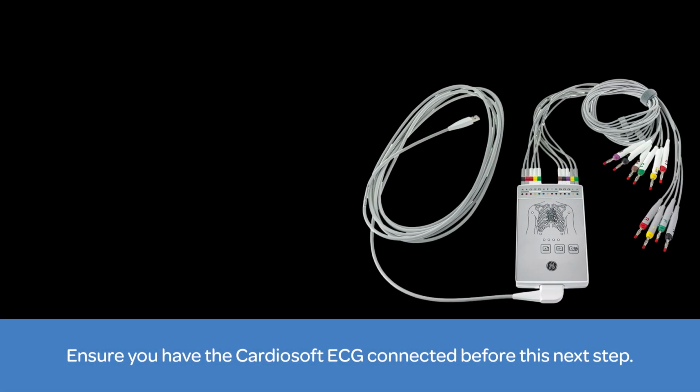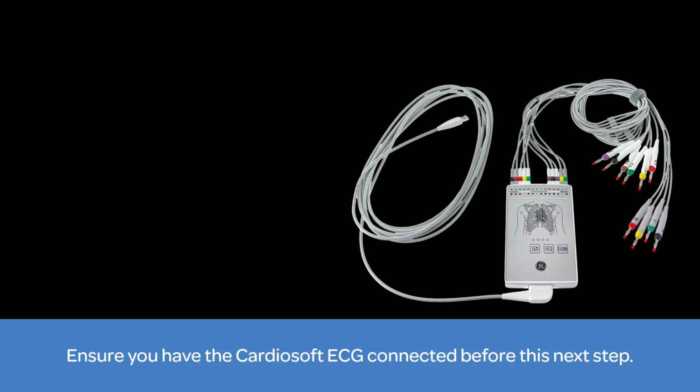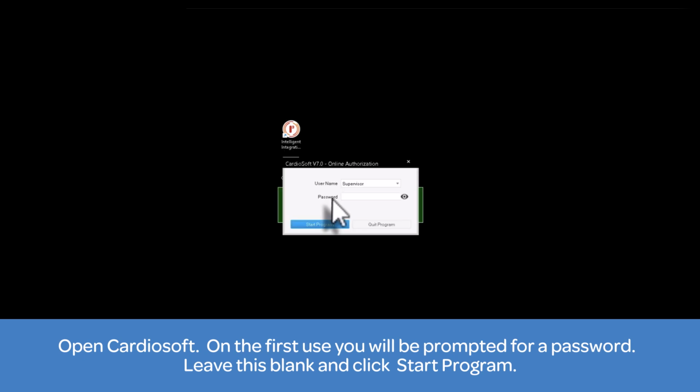Ensure you have the Cardiosoft ECG connected before this next step. Open Cardiosoft. On the first use, you will be prompted for a password. Leave this blank and click Start Program.